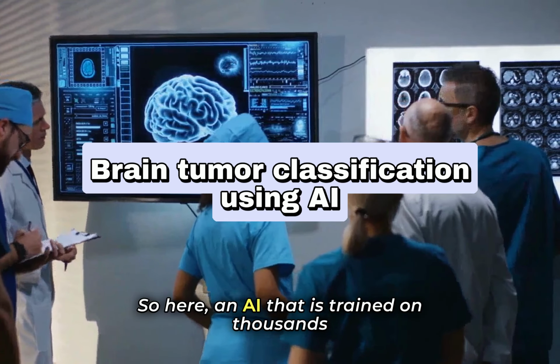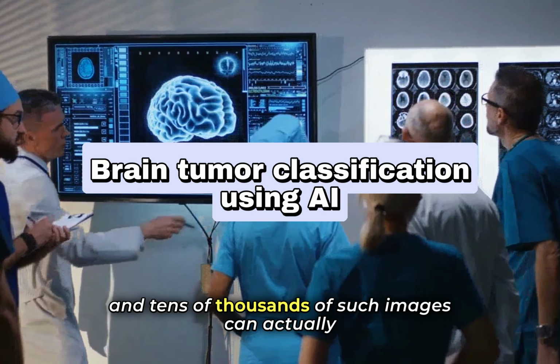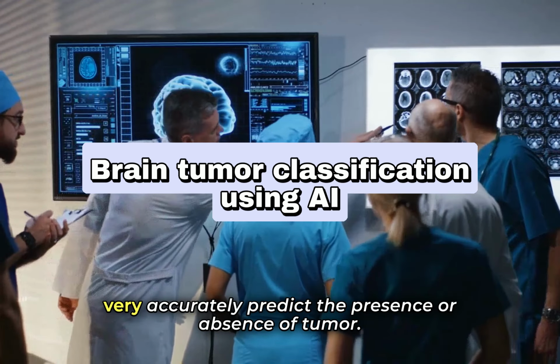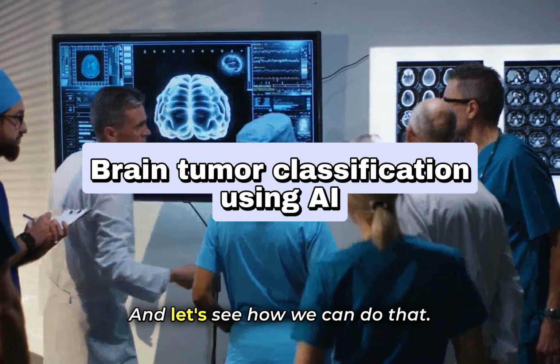So here an AI that is trained on thousands and tens of thousands of such images can actually very accurately predict the presence or absence of tumor. And let's see how we can do that.